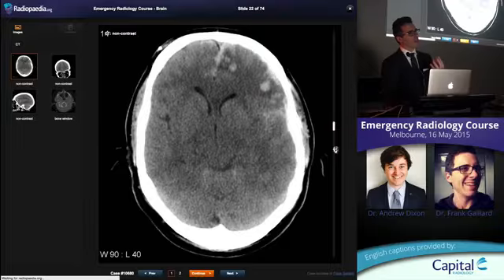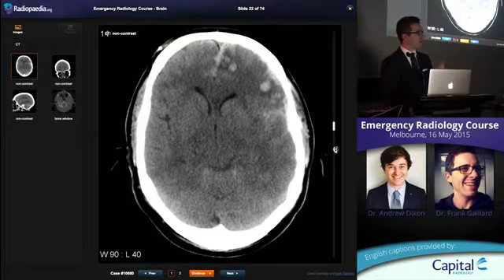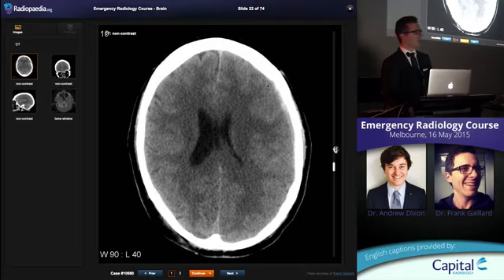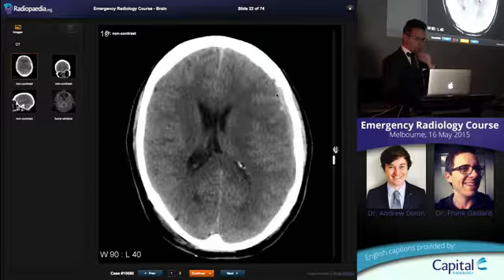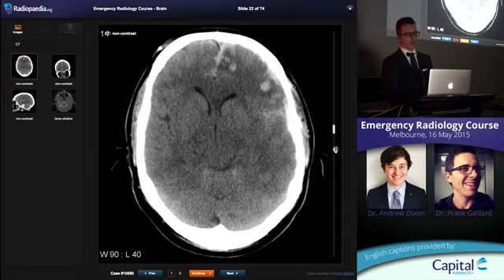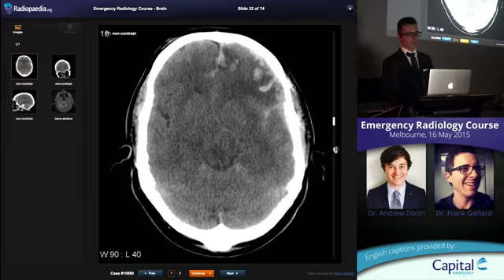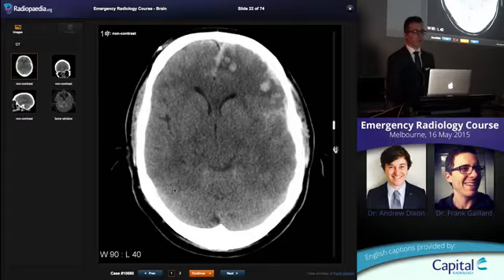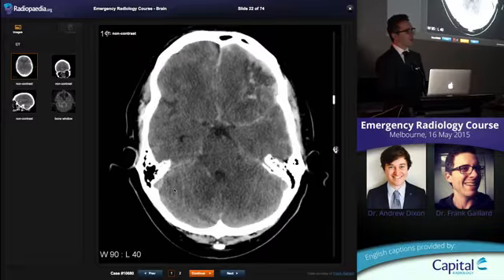So most of your aneurysms occur around the circle of Willis, 95% plus. So that's where most of the blood will be. It's very uncommon to have subarachnoid blood purely up the top. It's not unheard of. You can have mycotic aneurysms, you can have dural arteriovenous fistulas. But when that's in the setting of a good trauma, you have a lump on the scalp, you might have a fracture. Here we have lots of hemorrhagic contusions, and the only subarachnoid blood you see is tracking in the region of maximum traumatic injury or in a contrecoup distribution, so on the contralateral side, not in this case, then you can be more reassured that there's no underlying lesion.